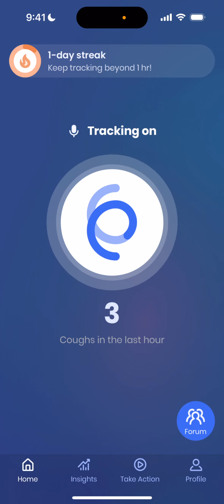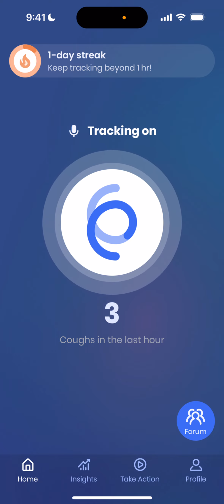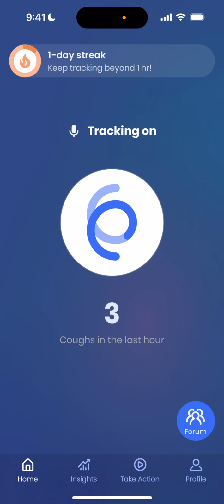Welcome to our CoughPro overview tutorial. In this video tutorial, we will explore the home screen of the app, the account profile, as well as provide a high-level overview of the different features available, including insights and cough management.